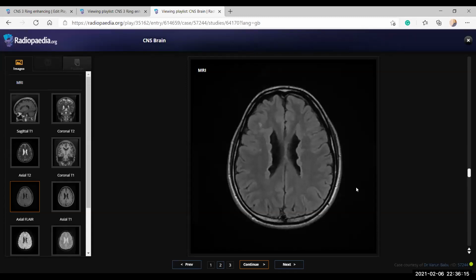My differential diagnosis would include subependymal cortical tuber of tuberous sclerosis, but this could sometimes be calcified and not like this. And I will confirm my finding and recommend it. So what will be the signal intensity of the subependymal nodules of tuberous sclerosis? Is it like this? No, if there is calcification, it could be signal void.